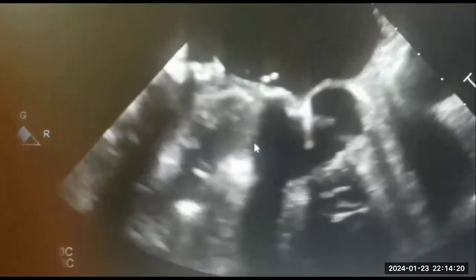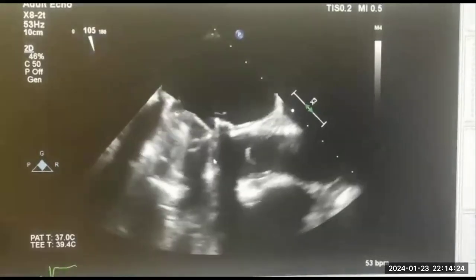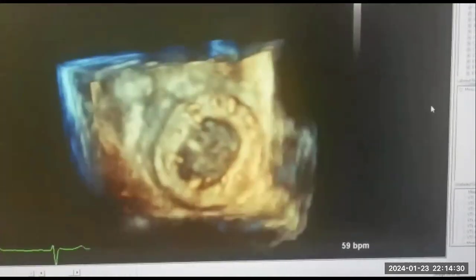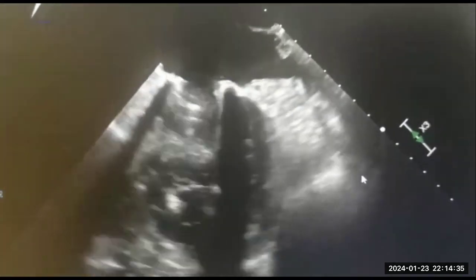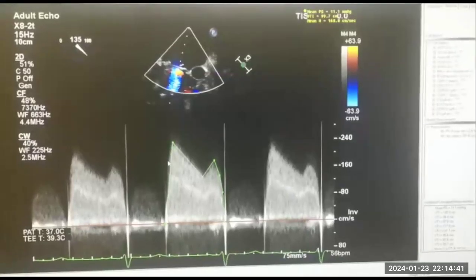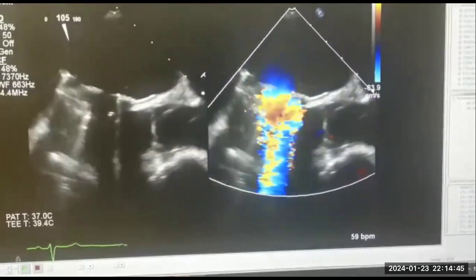Again, we are talking about TEE. So I am expecting one of the prostheses to come in the exam, either a prosthesis, mechanical. So what do you see here, Shaban? I think it's obvious, huh? Stuck valve. Yes, describe it, please.